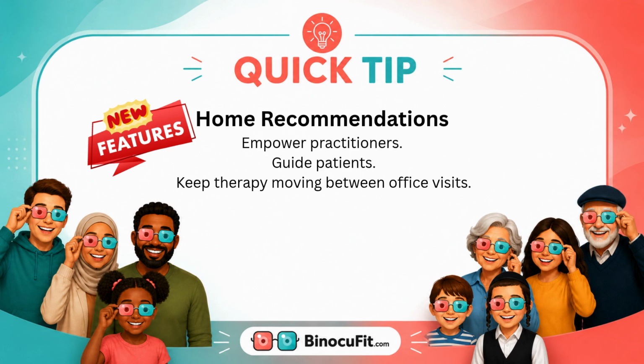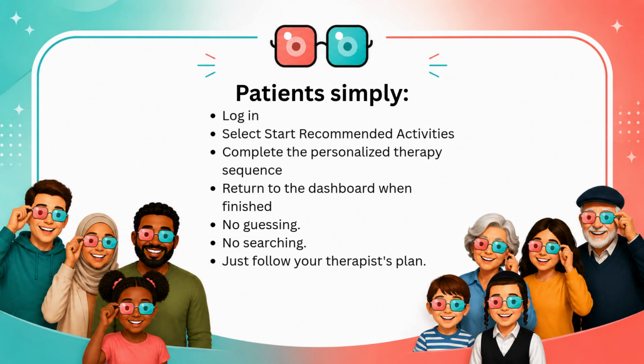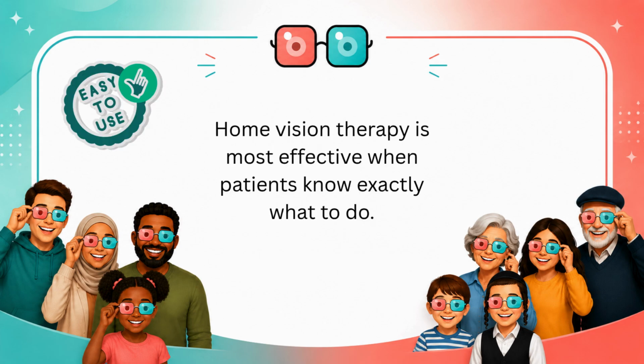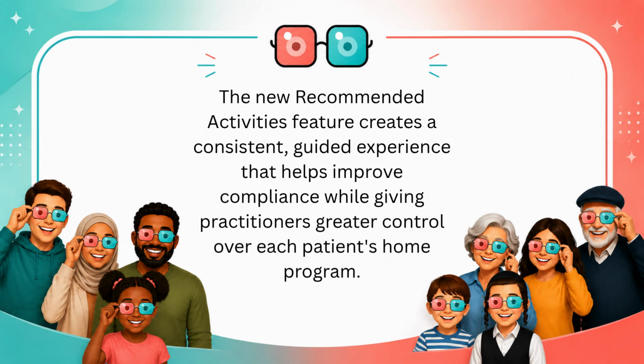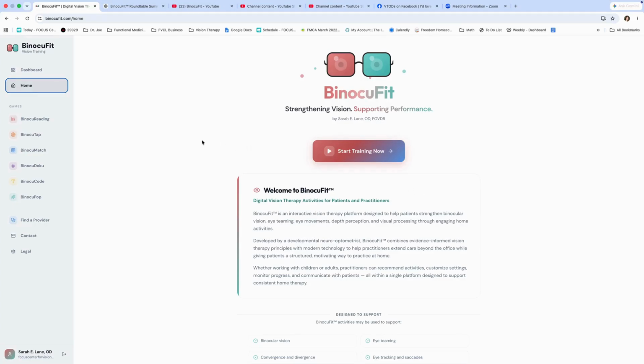Hi there. In this quick tip, we're going to talk about BinocuFit and how these home recommendations work. So these home recommendations are meant to really support practitioners and patients. Practitioners make the recommendations and patients simply log in, start the activities, and move seamlessly through it. It's very easy to use. So the new recommended activities make it seamless between practitioner recommendation and the patient flow.